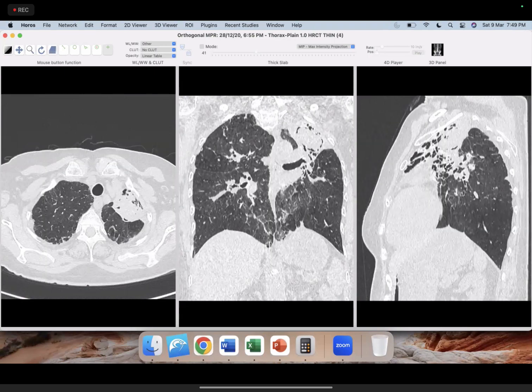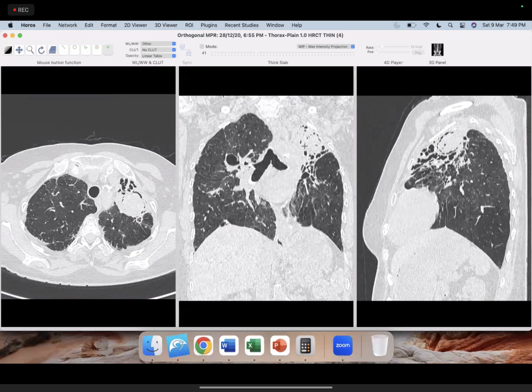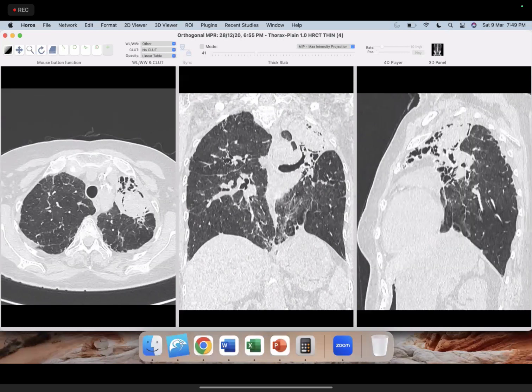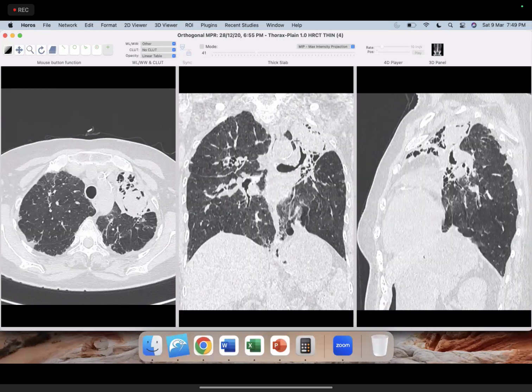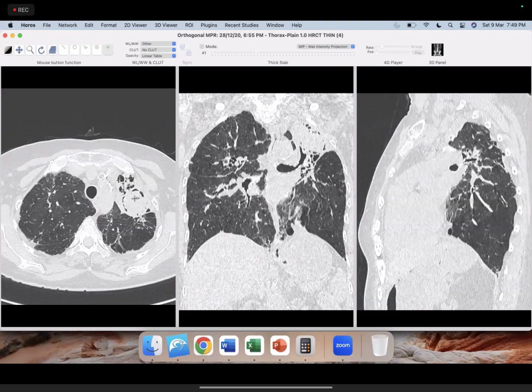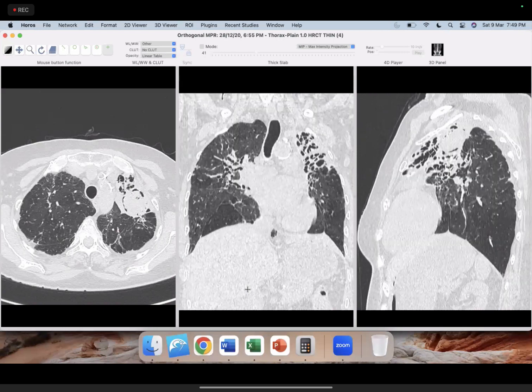So again, everybody got this right that this is a fungal ball, but get the terminology right also. A fungal ball or a simple aspergilloma is when the patient is not symptomatic and it is not progressive. Once they have symptoms, it is CCPA, and they will also typically show progression. That's why I always look at all the fibrosing ILD or any ILD cases for such complications also.